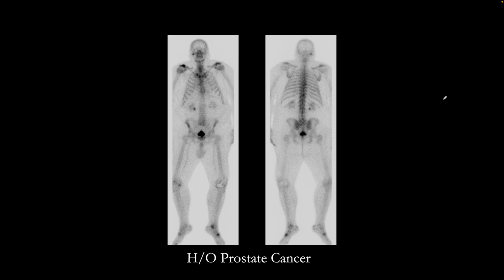This is our next patient. They have a history of prostate cancer, and we performed a whole body bone scan first. So on the anterior and posterior whole body images, we find some degenerative changes in shoulders, sternoclavicular joints, and the left foot along with the right knee. On the posterior image, in the lower thoracic spine, we see this focus of increased uptake that may represent bone metastases and should be evaluated further.